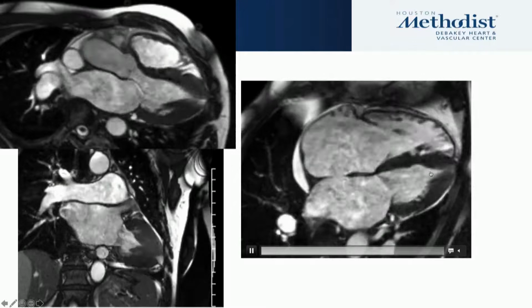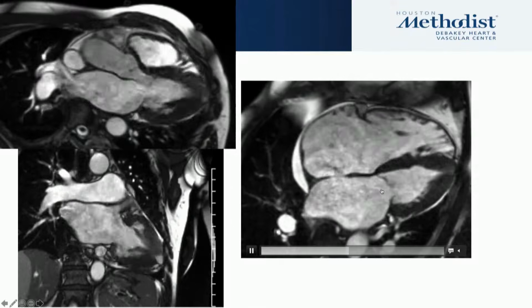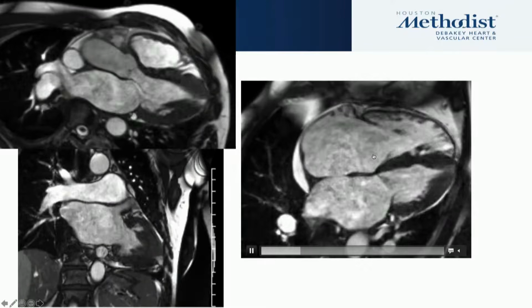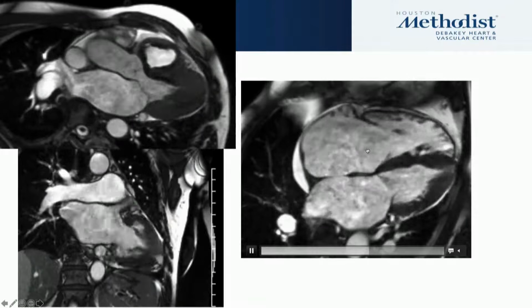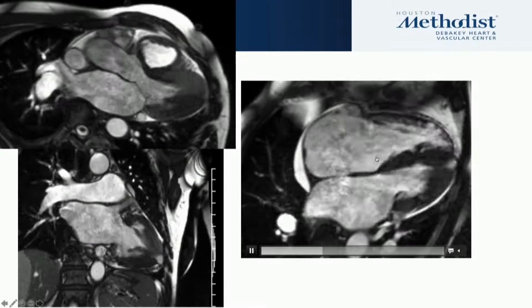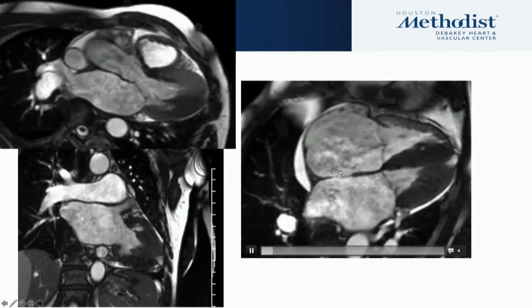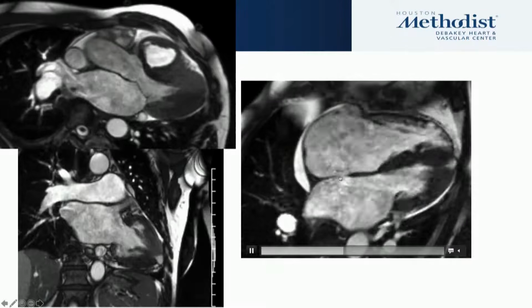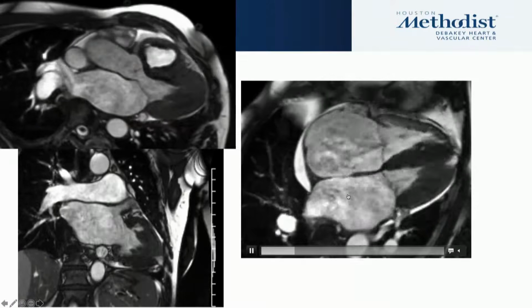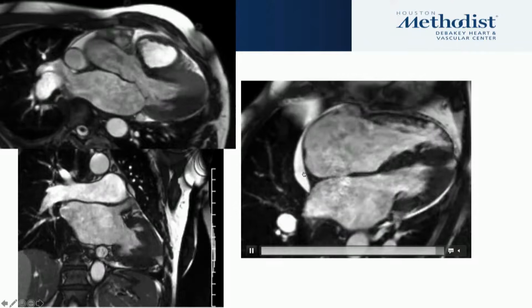Also, there is an apical systolic cavity obliteration, and the TR is evident. We cannot quantify from this, depending on the sequence that we do. We don't quantify just visually, but it gives us an idea that there's definitely a TR with the dilated annulus. Also, you can see here between the atria that there might be some shunting happening. It's not 100% clear, but you could begin to suspect, and it's important to point out a small pericardial effusion here.